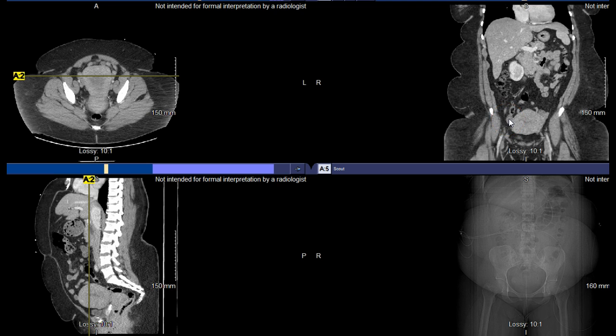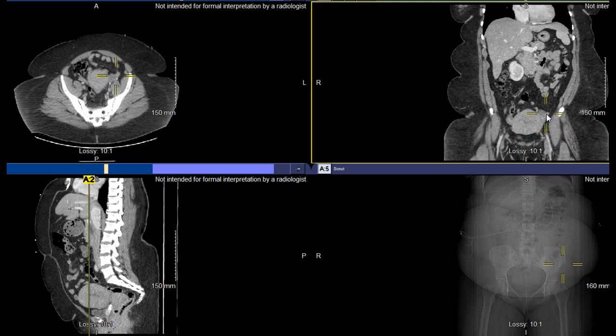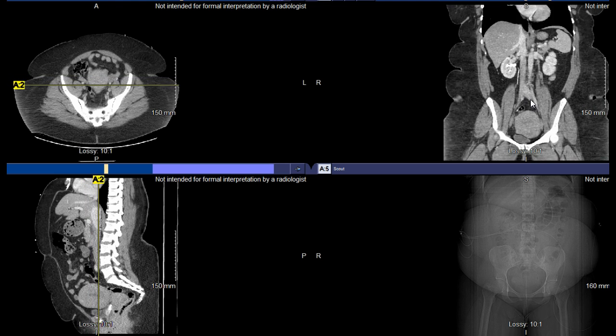And to help us identify that, we can just click on it and it generates over here exactly where that region is. So you can see it in that real-time differentiation, and see exactly where those structures are from one side to another side. As an example, these other slices are really valuable to pinpoint some of the anatomy, to look at it 360 degrees around and see things from start to finish.